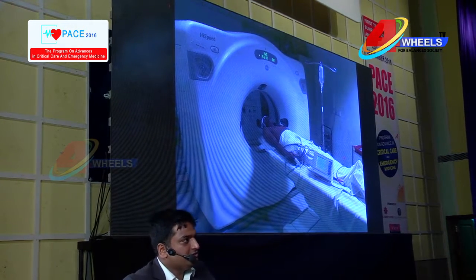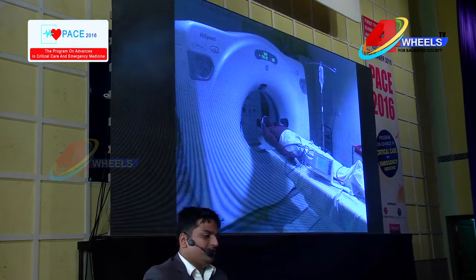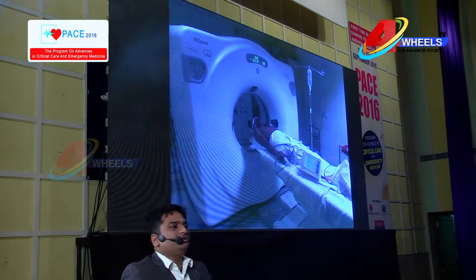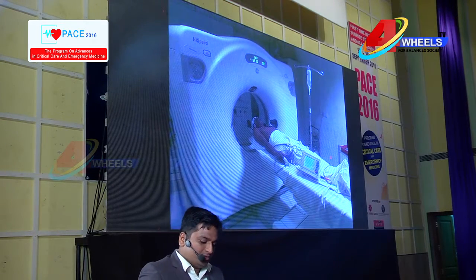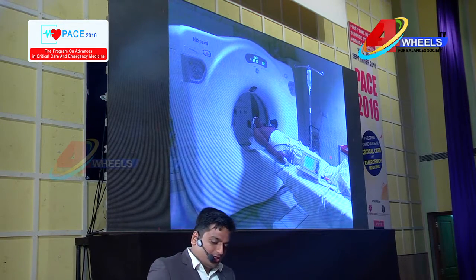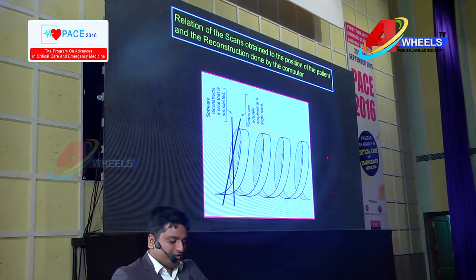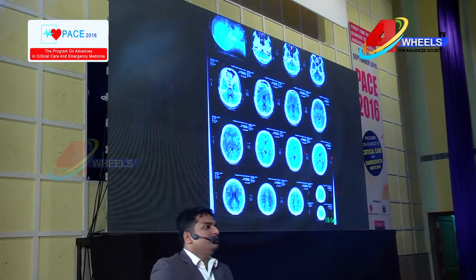Have you all seen this image in your CT room? This is the gantry. This is the main source for the CT. It has a source and a detector, and the patient is put on the table and moved to and fro. X-rays are bombarded to the patient at 360 degrees in a spiral way. At the same time, the detector is 180 degrees opposite to the source, and whatever information it gets, it will push to the computer and we get an image. Generally, the X-rays are taken at a slight slant, and whatever we get will be reconstructed by the computer and we get this image.